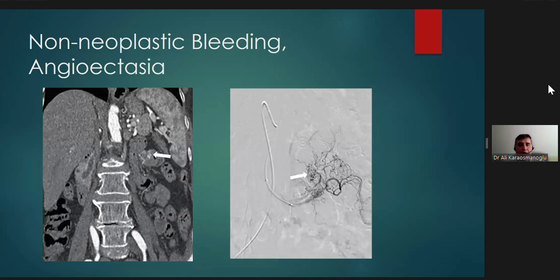So angioectasia, it's tough to diagnose clinically. And also from an imaging standpoint, it's tough to diagnose. But you have to be really diligent while looking at, especially, the arterial phase images of CT. So on the arterial phase image, coronal format, in one of the jejunal loops here, proximal jejunal loops, you can see ectatic, enhancing areas, and they do not change in configuration on the portal venous phase.